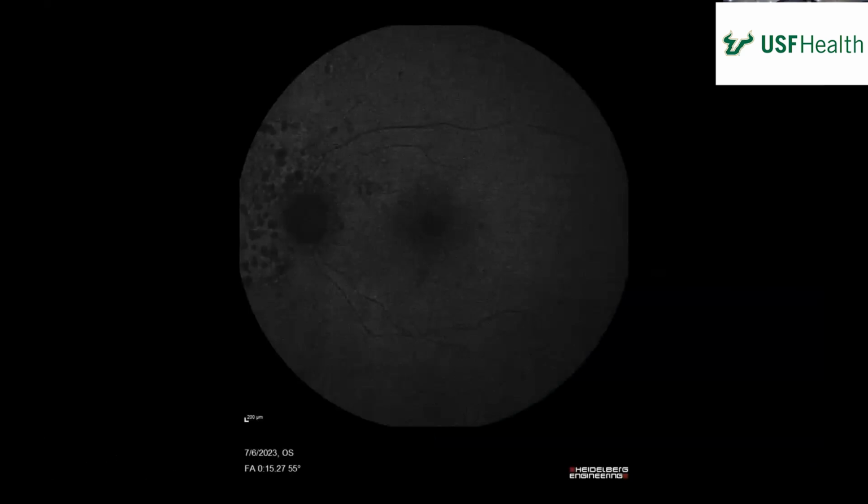Okay, so it looks like FA, like the pre-arterial phase. It's pretty early on. What I want you to pay most attention to is the timing down here on the bottom between the choroidal phase and the arterial phase. We kind of lose it on our view. I'm trying to figure out how to fix that. The timer, you might have to read it to us.